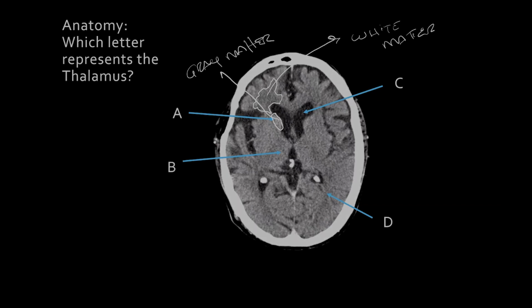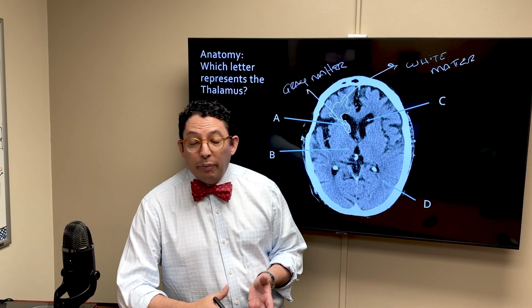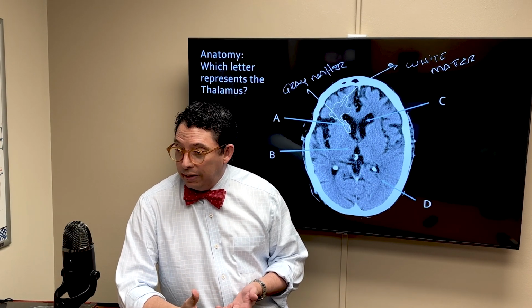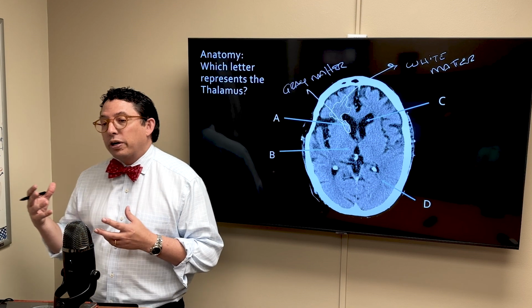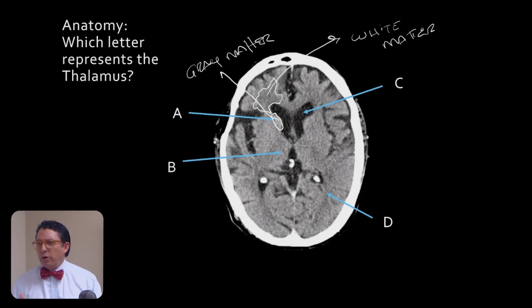So the differences between gray and white matter is that the white matter looks in a matured brain, so after 2 years of age, once it has myelin, it's going to look slightly darker than the gray matter. And that's how you do the gray-white matter differentiation, which is so important in so many things. Think about stroke. We're going to talk about stroke also in this course.